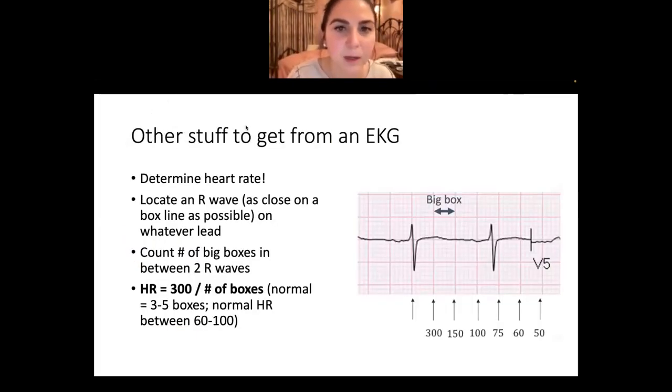Okay. And the other thing I wanted to mention, because this does come up, I think on my exam at least, is heart rate. Without being told what the heart rate is, they just give you an EKG and you can determine what the heart rate is. I don't know if you guys have heard this trick. This is straight from Boards and Beyond. Try to find an R wave that's exactly on one of these lines.